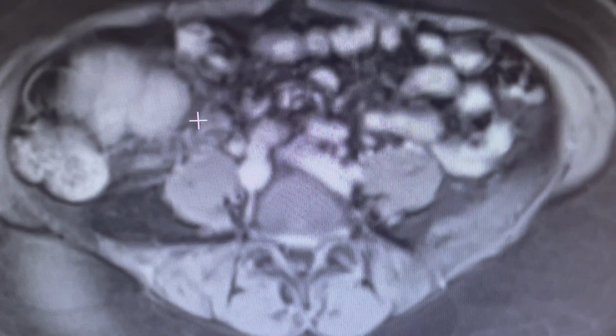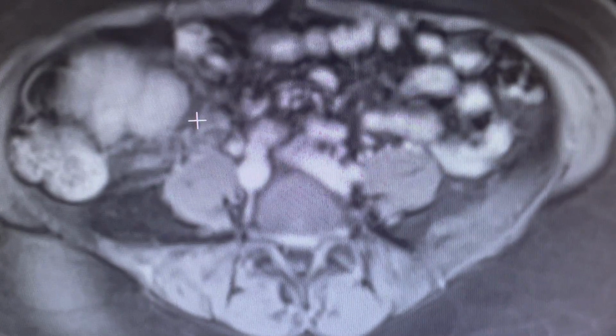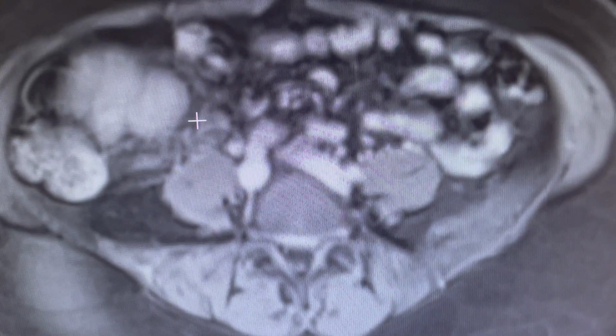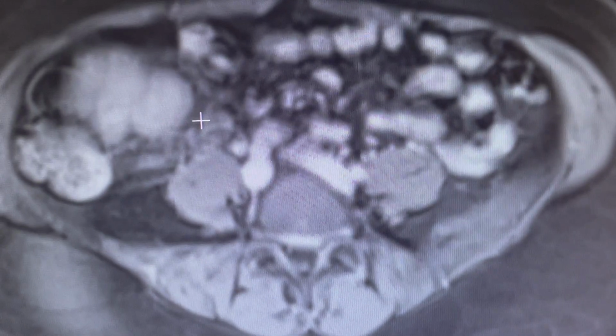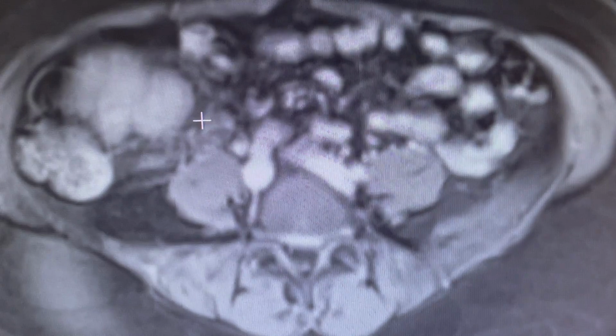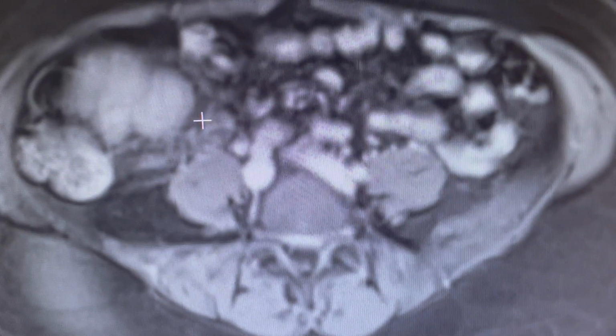The next point is that hypervascular metastases fade to isointensity with liver, or they can at times wash out, but they do not show retention of contrast, which these larger ones did.